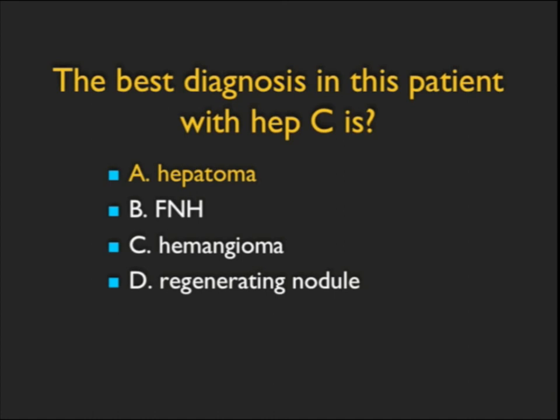So with that, I've showed you 10 cases. I've showed you a lot of different imaging techniques, from dual energy to virtual imaging to cinematic rendering. I hope you enjoyed the cases. I hope you learned something, and I hope you enjoy March Madness.